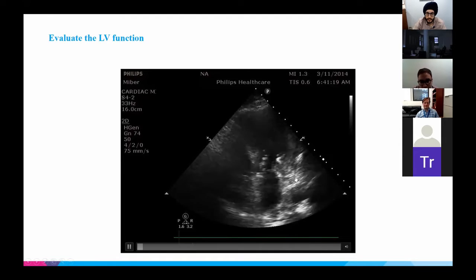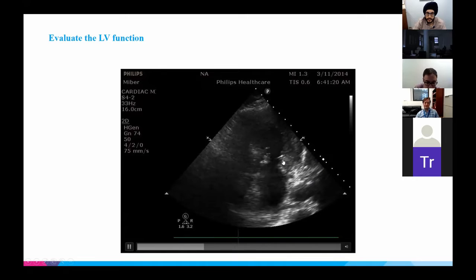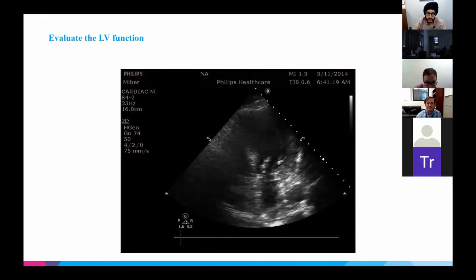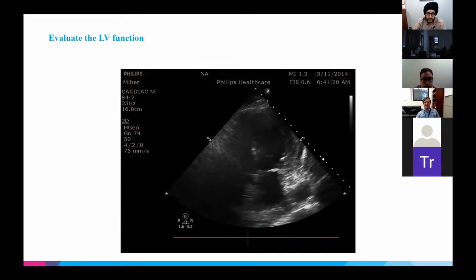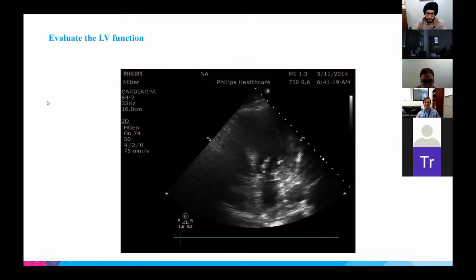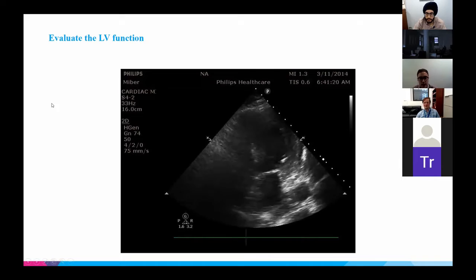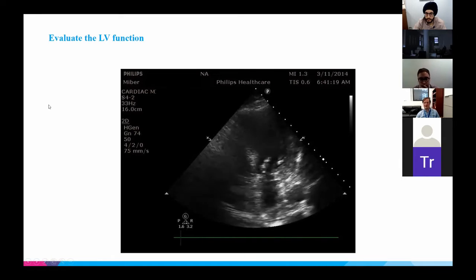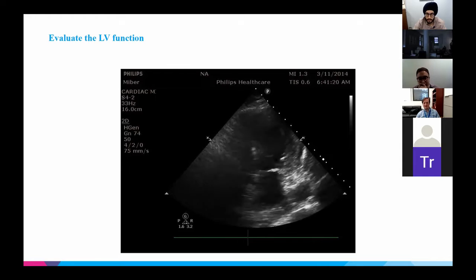Of course, this is not an ideal view, and I'd want to see more, but that's what we can begin to tell from this. Any questions about any of these so far? I have a few more examples, and I suspect, as we get more practice with them, that your percent correct has already started to improve significantly.